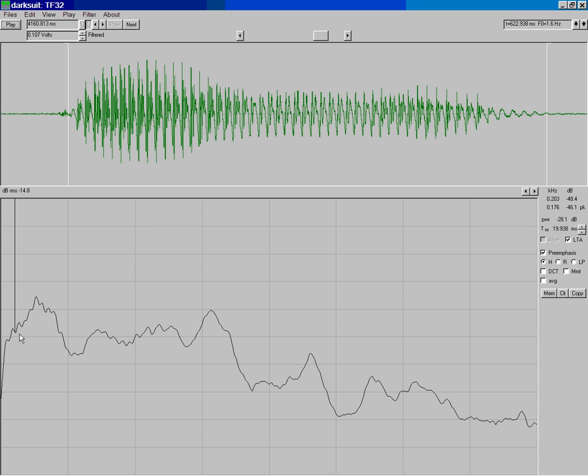As you can see, when you do that, you lose some detail. You don't see the harmonics as clearly because there's some smearing that goes on. Since the harmonics are moving around, you don't see distinct harmonics, but you do see where the energy tends to be lying within the speech sample itself. So the long-term average spectrum is often used to give you more of an overall representation of where the energy lies in a segment of speech.